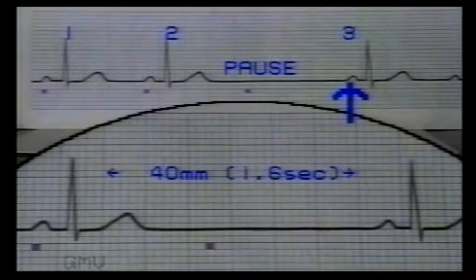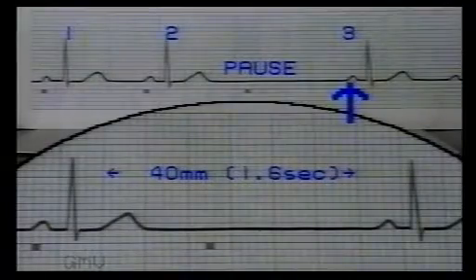occurred in this case after 1.6 seconds, or if it doesn't, then some lower ectopic focus will fire an impulse and stimulate the heart. It will be worthwhile remembering here that there are several pacemaker cells capable of firing impulses in the atria, AV node, bundle of His, and Purkinje fibers in the ventricles.